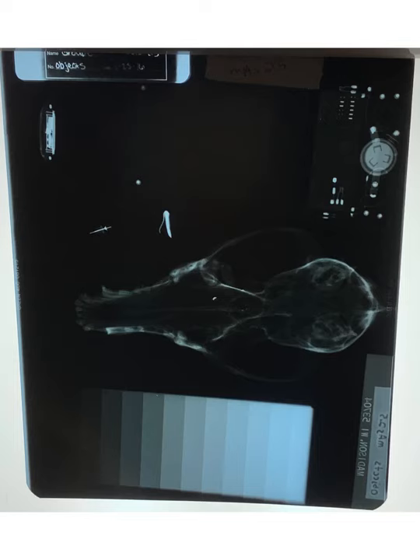So now on this particular x-ray, we went all the way up to 80 kVp. Kept that MAS the same, but now up to 80. Now on this one, let's start just looking at this skull. This skull, it's super black. Even the thickest areas of the skull now look gray. We don't see any white on this x-ray. It's dark gray, maybe a few light grays, and black. A lot of force. Pretty much all of these x-rays went through what we were x-raying. They hit the image receptor, and we see a really black looking image.